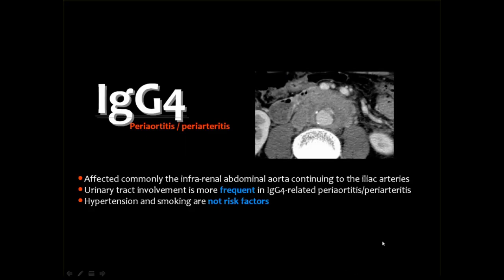And finally, the periaortitis or the periarteritis, which is an inflammatory reaction occurring around the aorta and also some of the vessels, especially the common iliac arteries.